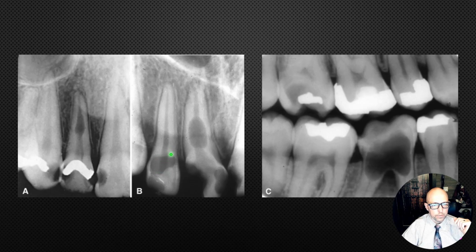Is this internal resorption where the canal space just widens around it, or do you still see the canal, the pulp space, going through the lesion? And so this just looks like a radiolucent, probably a facial composite on that lateral incisor. And there's a pretty extreme example of internal resorption coming from the pulp space, really resorbed through the trunk of that tooth.